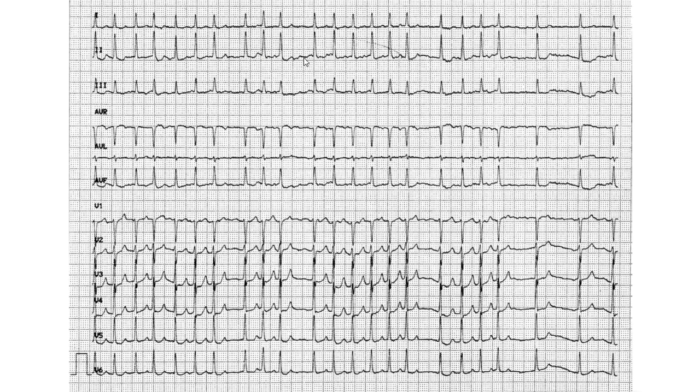Something's going on. What is this? P, QRS, or like QRS, T, P, P. No, that's not gonna work. Here as well, the empty spaces, there are multiple empty spaces to help you notice that there is fibrillation going on.